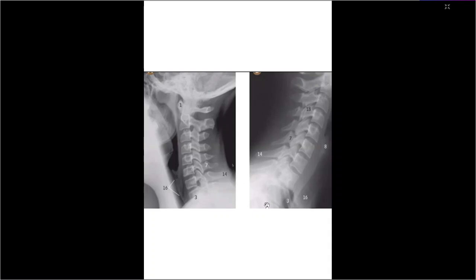Okay. Tell me what is structure number 16 here? Trachea, yes, trachea. Then what is structure number 8 here? It is higher, but not too far. This is the larynx, sir. Okay, this is the larynx. So now tell me about this structure number. There is some bone here, correct? Hyoid bone, sir. What is the level of this hyoid bone? C3. Good. Very, very good.